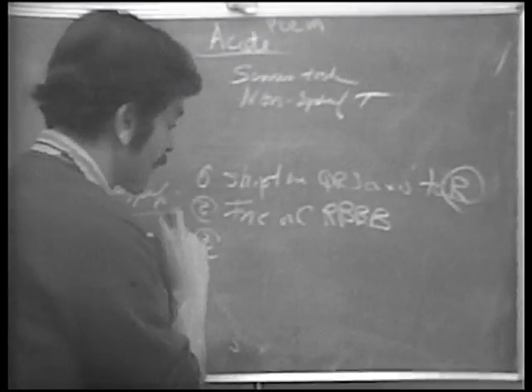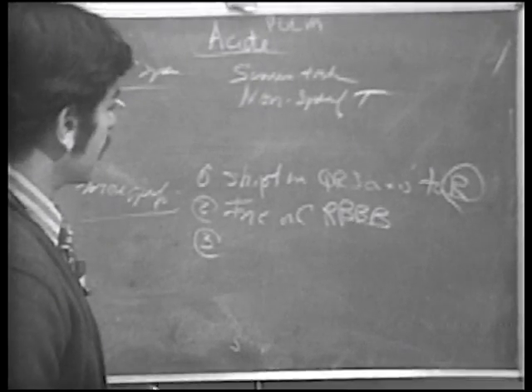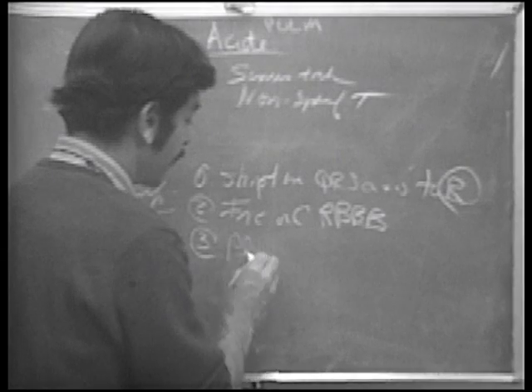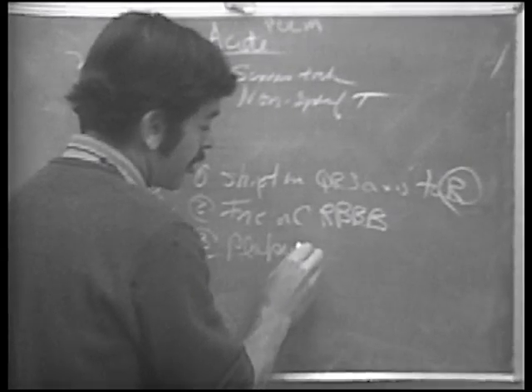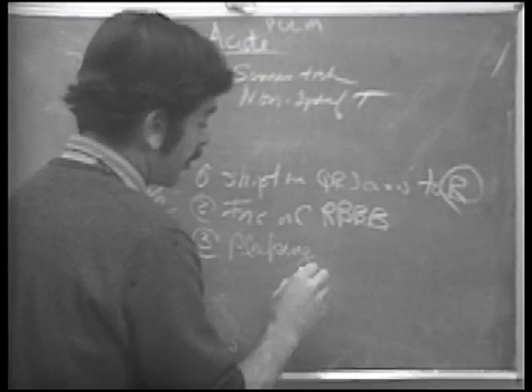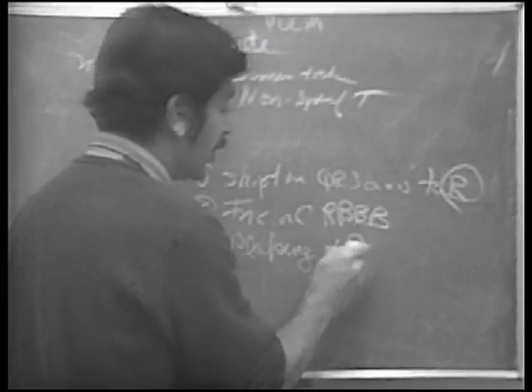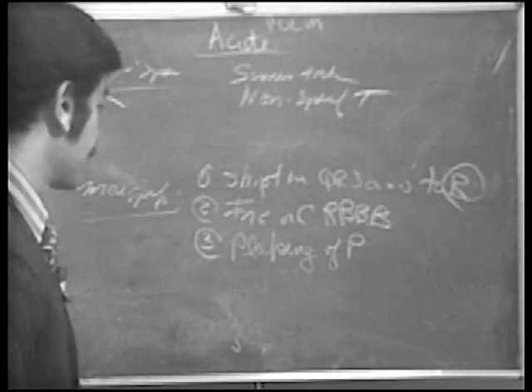A third thing might be some peaking of the P waves. This is not too reliable again, but something to look for. Peaking of P's, an increase in the height of the P wave.